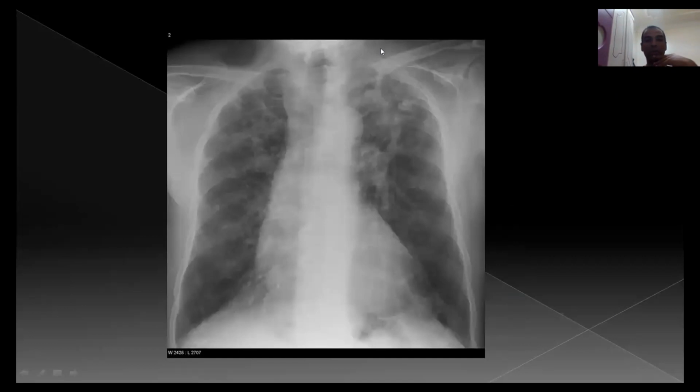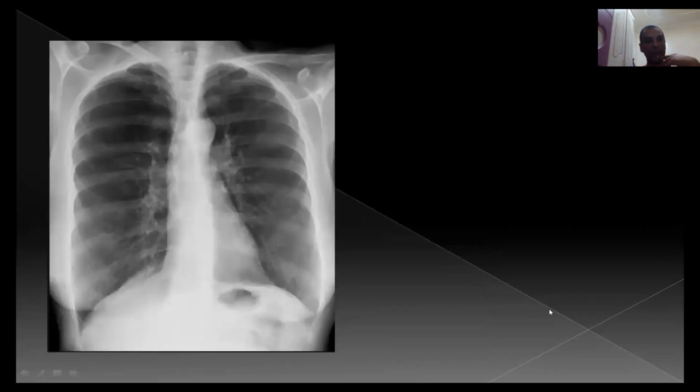Also, we have here distortion of the lung architecture, and fibrotic bands. Any fibrosis makes traction. Look at this one, the left hilum: it is tracted and uplifted by the fibrosis. This confirms there are dense fibrotic changes in the upper lung fields from old TB.